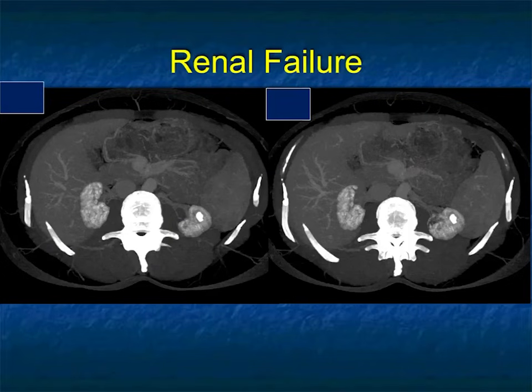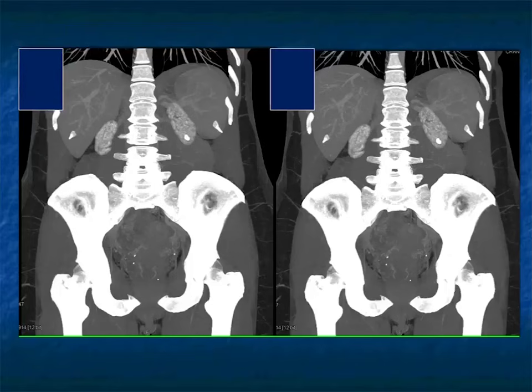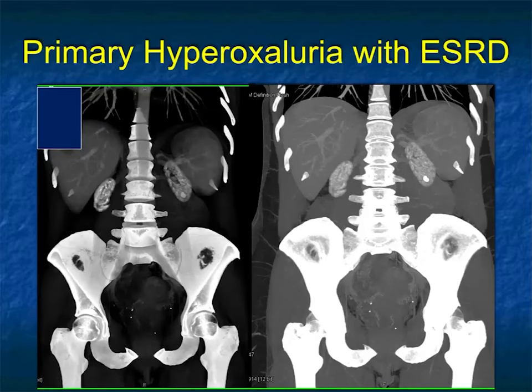Renal failure, okay, another case. But the kidneys are very dense, they look calcified, they're calcified and small. What gives you small calcified kidneys? Renal tuberculosis would be a good thought. Prior infarcts might be a good thought, but just total atrophy like that is unlikely. And calcification, again, I'd be pushing, I think of infarct because of calcification, but I've got to be thinking about infection, TB, but there are other things like oxalosis, primary hyperoxaluria with end-stage renal disease, small high-density kidneys, lack of visualization of function, a really nice case.